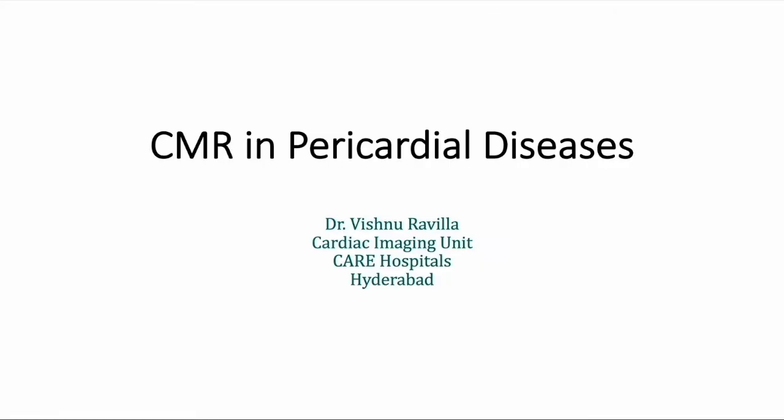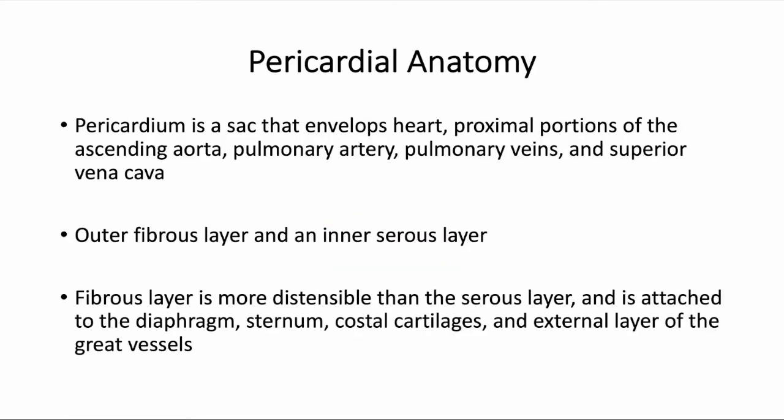Hello everybody. In this short video, we will see how cardiac MRI can help us in evaluating various pericardial pathologies. First, we will look at the pericardial anatomy in brief and then go on to the various imaging features.